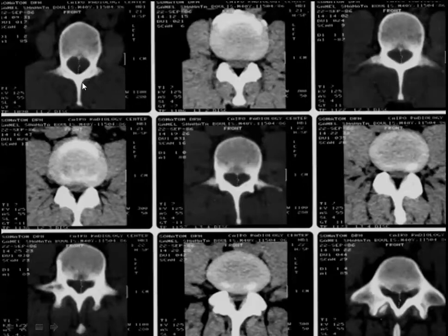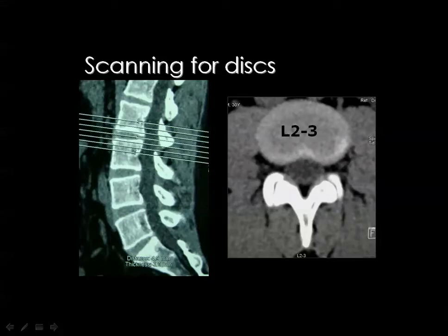If you measure the diameter of the lumbar spinal canal and you see the distance here is 1.2, you know that this canal is relatively narrowed, while here 1.1 is also relatively narrowed, and here 1.0 is also narrowed, and 1.1 is also narrowed, 1.4 is normal. So the diameter of the spinal canal may be normal at some levels and narrowed at other levels, and you should mention this in the report.